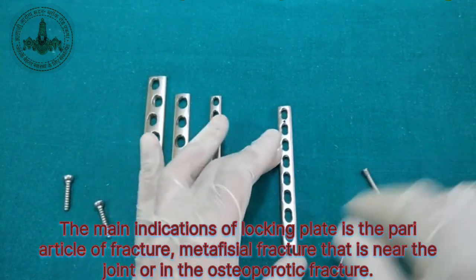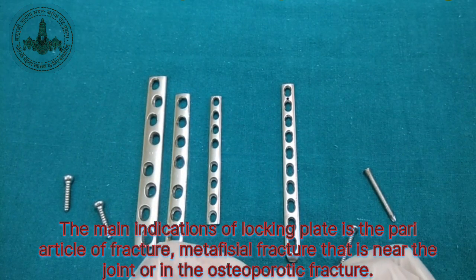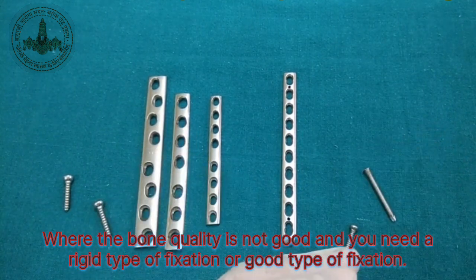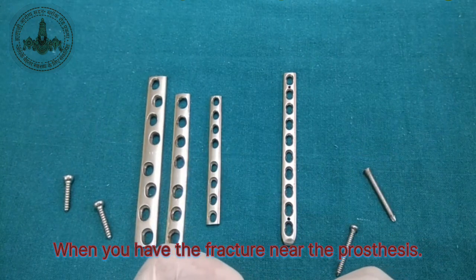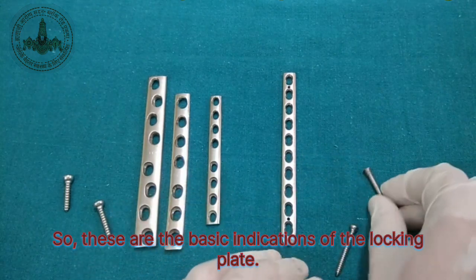The main indications of the locking plate are the periarticular fracture or metaphyseal fracture, that is, near the joint, or an osteoporotic fracture where the bone quality is not good and you need a rigid, good type of fixation, so you have a better purchase of the implant. And the third possibility is a periprosthetic fracture, when you have the fracture near the prosthesis. So these are the basic indications of the locking plate.